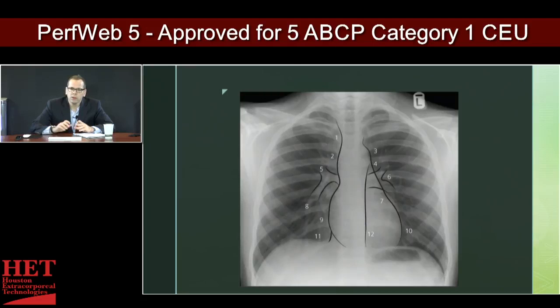So with an x-ray, the soft structures, everybody kind of understands the bones. You see the ribs, they're blatantly obvious, the clavicles, the spine, etc. But when you look at the soft tissues, it's kind of hard to determine oftentimes what you're looking at. If the pericardium's been open, the mediastinum's going to be wide, and so you just see this big white blob in the center of the screen. But there are certain things that you definitely want to look at here.